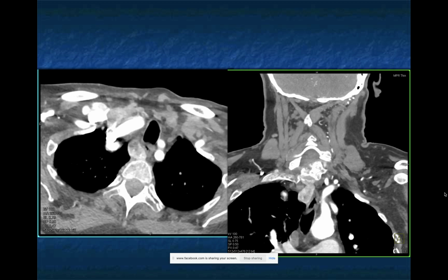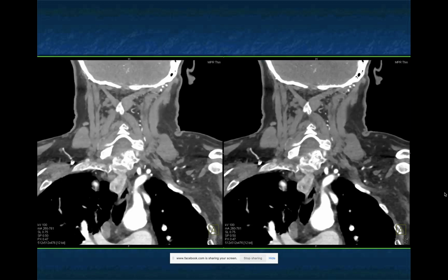Lymphoma, just that one thing, unlikely. Now, you could say, well, maybe if I gave you all the scans, this comes from the thyroid. Could this be accessory thyroid tissue? Could this be thyroid hanging down? But I'll tell you, it was separate from the thyroid. So you ask the question, what else could be? What else can we see in that mediastinum?